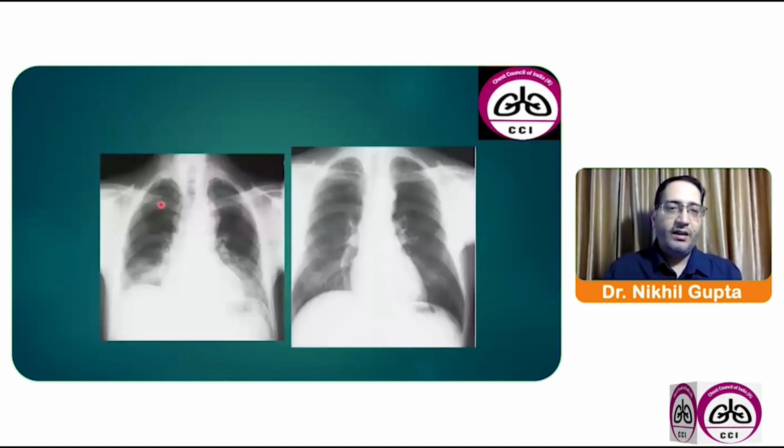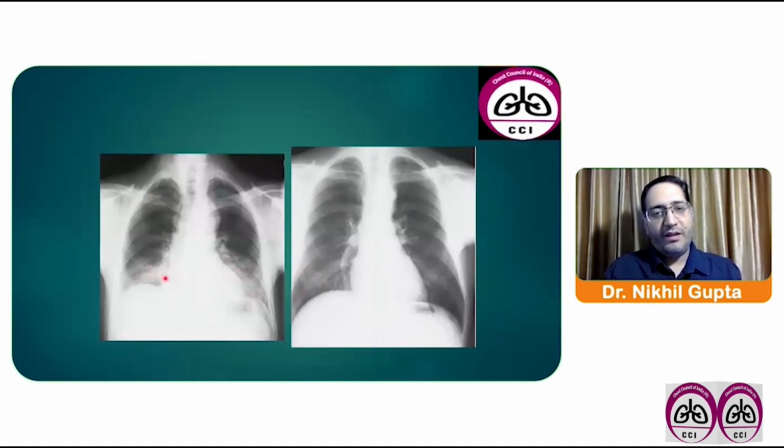As seen here, this is an expiratory X-ray, and this is the inspiratory X-ray, which was later found to be absolutely normal. These are false opacities, as seen here.